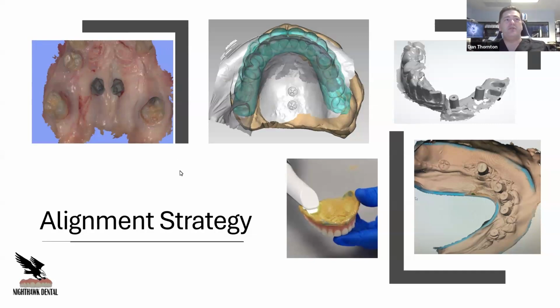The other way is to do more or less like a denture, doing a wash underneath of it after the surgery is done. That picks up the caps that you can use for alignment. You just have to 360 scan that, scan the bite. You can do half the surgery and then place the implant scan caps on top of that, because you have to have something in your first scan and something in your surgery scan all the way through to the final. That way you have something you can reference as you go through your stacking on your cases.